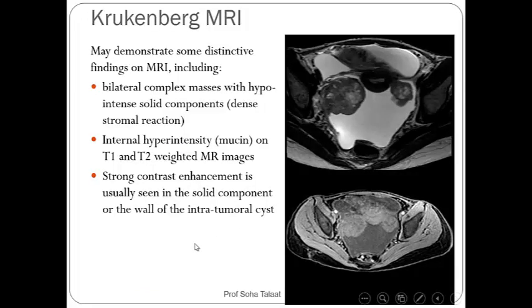So again, we are in a debate. Of course, it will not affect the management of the patient. In this case, 60 years old, they can do panhysterectomy together with the colonic resection. But sometimes we have to look at the morphology on MRI and the functional characteristics of the MRI regarding restriction, since the fibrothecoma can be restricted if it is cellular, and the dynamic post-contrast study.